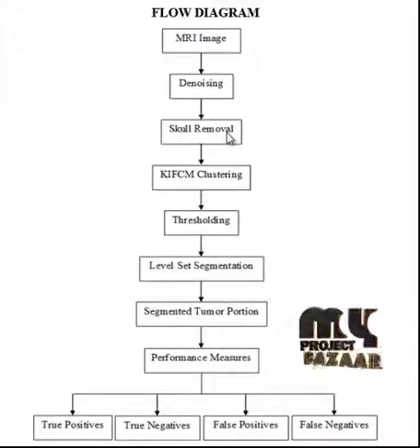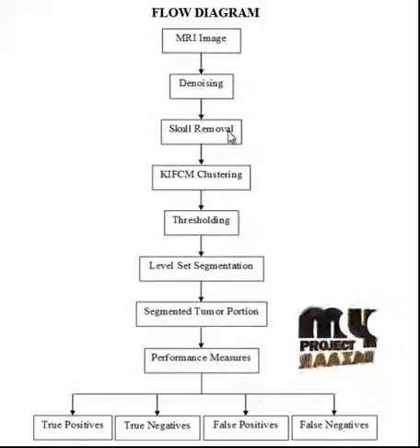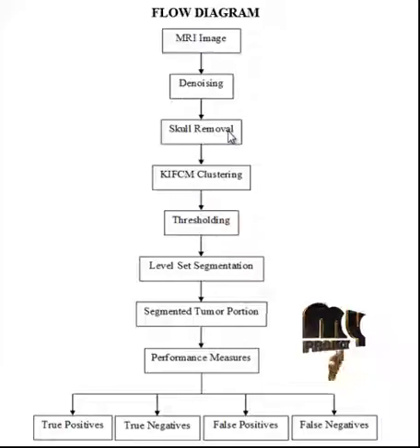The next process is the skull removal process. The skull regions captured along with the brain regions in the images were different in intensity and larger in area. The skull regions were identified and removed based on the morphological operations. The morphological operations employed were open and close operations.